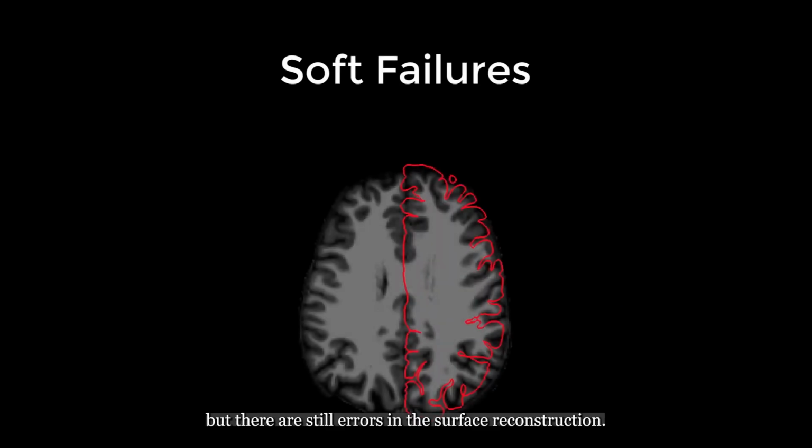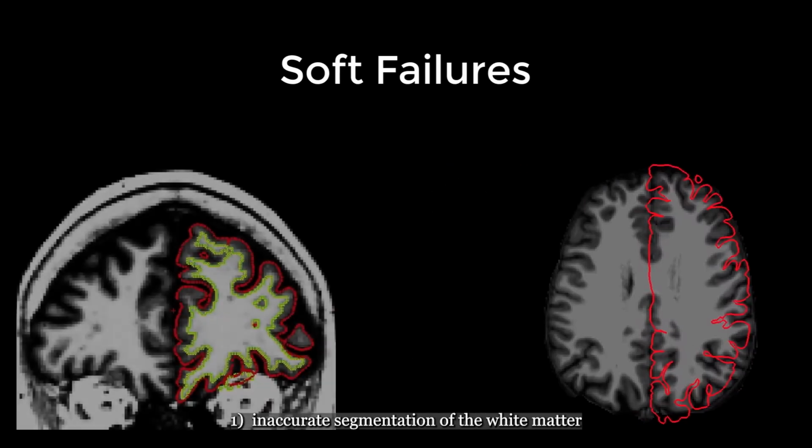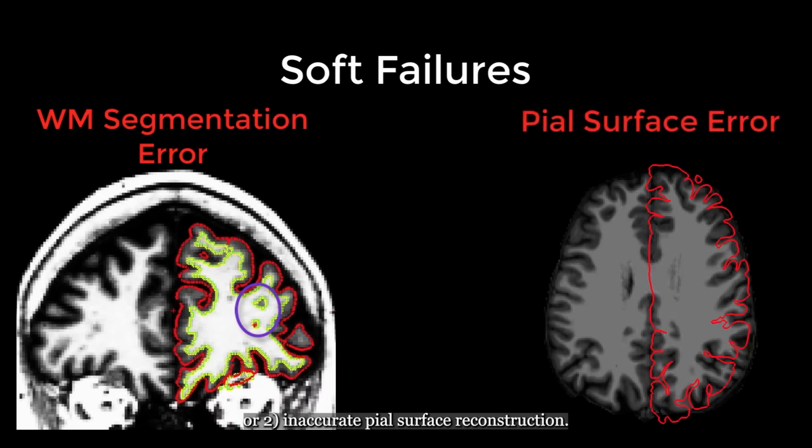More common are soft failures, when Recon-All completes successfully, but there are still errors in the surface reconstruction. The result is either 1. Inaccurate segmentation of the white matter, or 2. Inaccurate pial surface reconstruction. Fixing this requires editing the volume, because it is not possible to edit the surfaces directly.